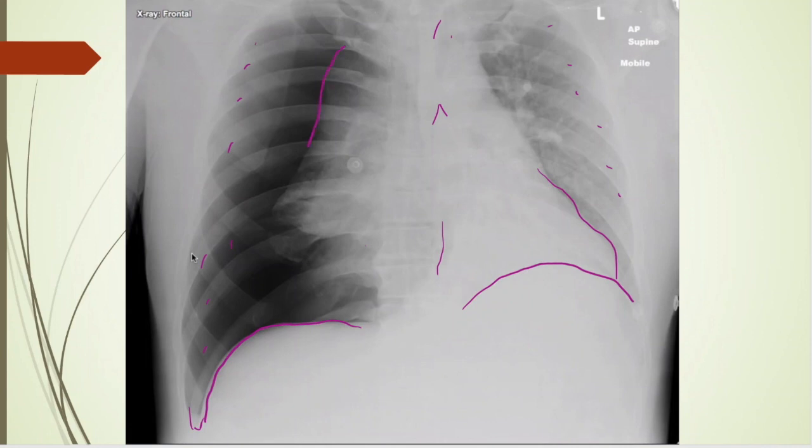This here is the lung right here. So this is a tension pneumothorax because the trachea, heart, all your major vessels are pushed way over the patient's left side. I would imagine he's not doing very well. Just on a side note, you see this deep sulcus sign here as well. That's just interesting for us nerds. You don't really need it to diagnose this pneumothorax because it's really huge and it's a tension pneumothorax.